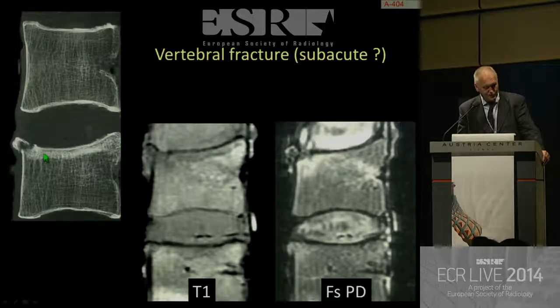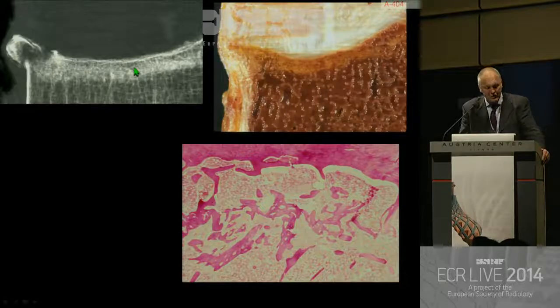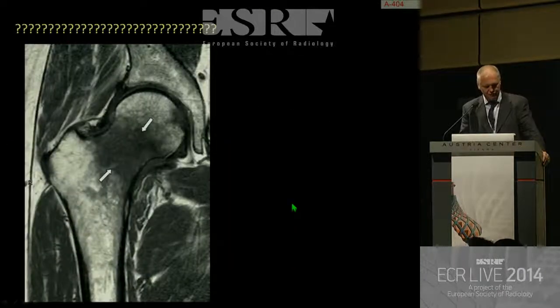And if you look at the X-ray, you will see that area of sclerosis, which is always or quite frequently located underneath the vertebral plateau. And this is the cartilage, the subchondral bone plate, and this is the fracture with callus formation and a little bit of marrow infiltration. This is what we see every day on T1, on T2, and if you add gadolinium and you use a spin-echo T1 weighted image, you have a return to normal, which is an excellent sign for a benign fracture.